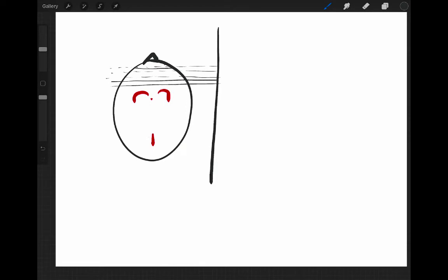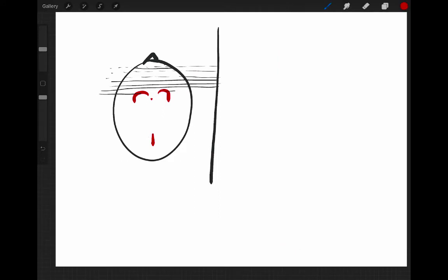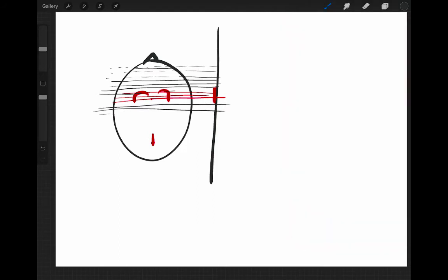Not very much interesting stuff happens here, but as soon as you hit these things, which are very bright in the image, you will end up with essentially a line here, which is the projection of those objects onto a perpendicular screen. So you can see how that works there. I'm switching back to black because there's nothing of interest in this intermediate bit here.